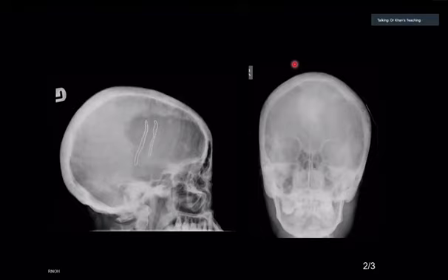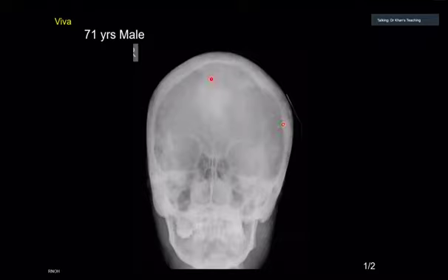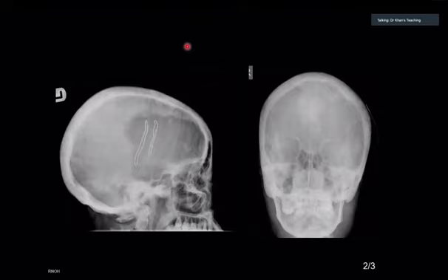Okay, just stop here and you can mute yourself. So this is Paget's disease. The key finding here was that you see this thickening and you see this lucency here. Paget's disease is an extremely important case for the exam.